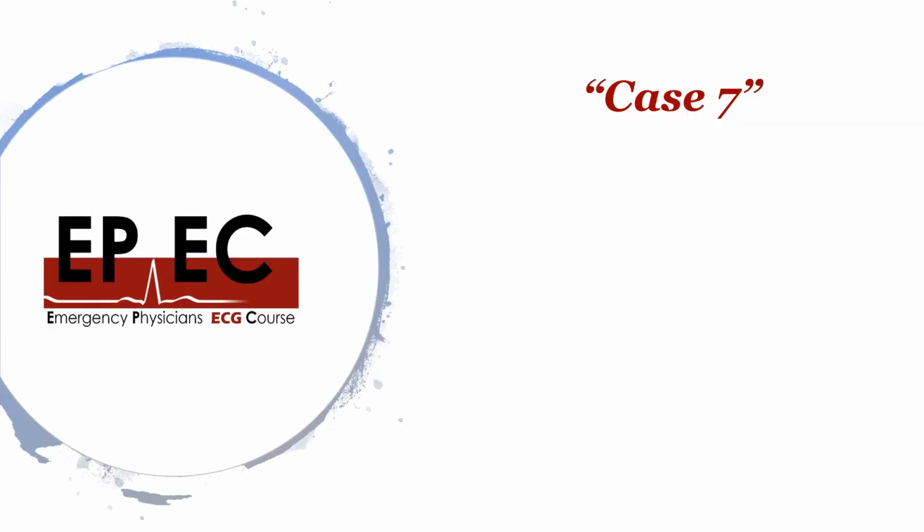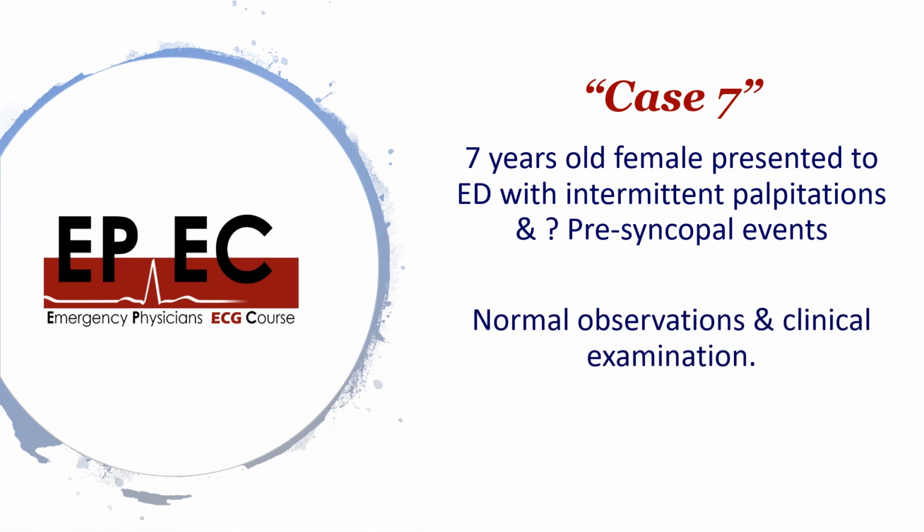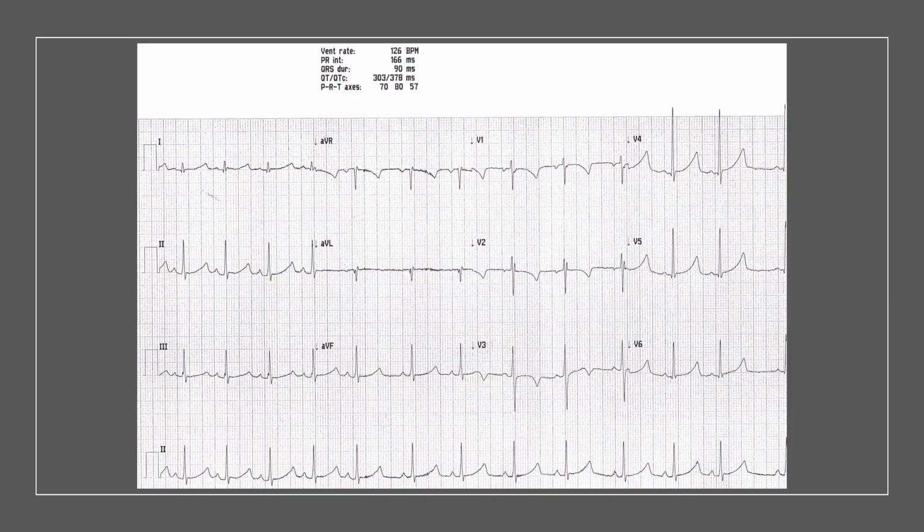The case that we're going to talk about was about a 7-year-old female presented to ED with intermittent palpitations and some query pre-syncopal events. She has normal observations on arrival to ED, and the clinical examination of her was absolutely fine. So she's had an ECG done.